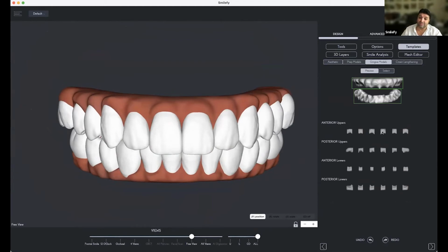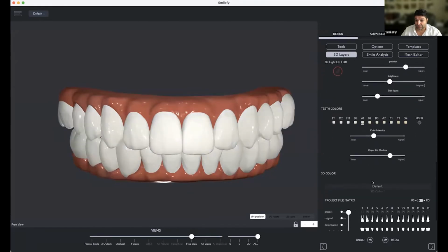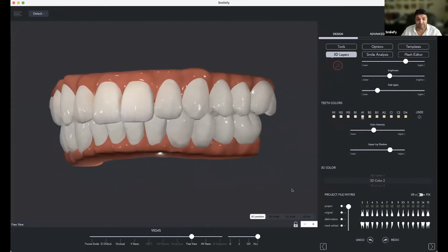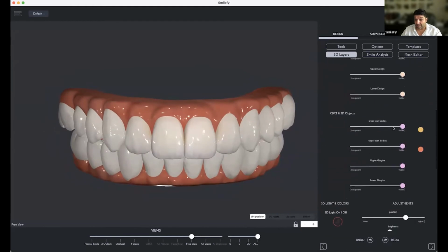And you have also pieces of prosthesis. If you, for example, have an extraction and you have bone loss, then you can use just one for the central, for the lateral, for the canine, and so on. Now we have the full arch implant bridge. If you turn on the lights, then you get a very nice representation of your full arch implant bridge. And that's how everything looks superimposed, right?